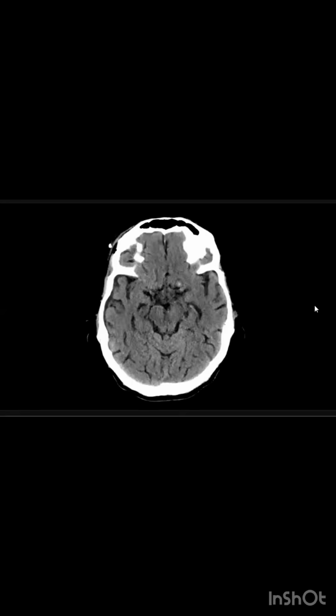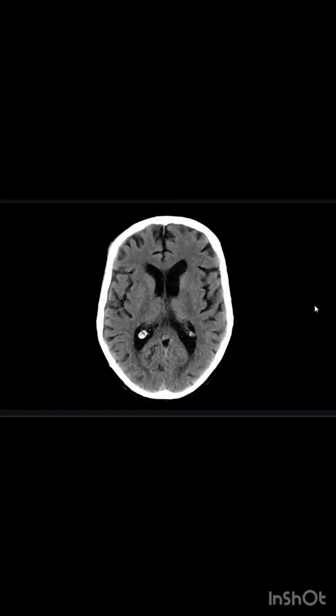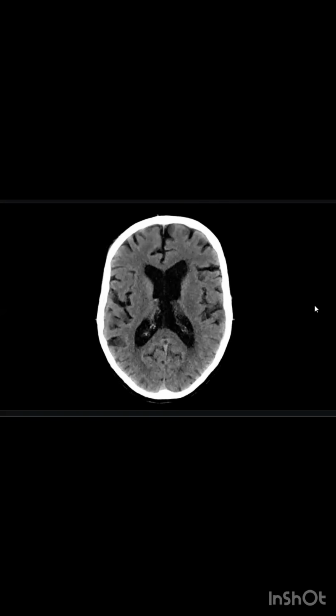Sir, I'm unable to scroll it. Just click once and scroll by your trackball or arrow up and down. You are scrolling now. Okay, so can you please repeat the history? Okay, 75 years old male patient presented with fall with head strike.